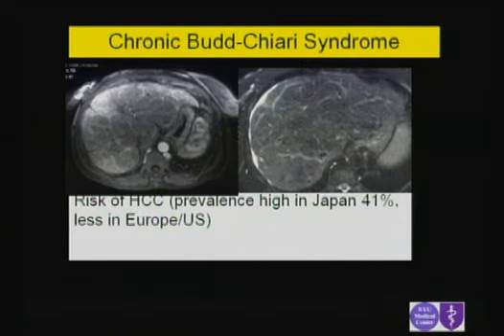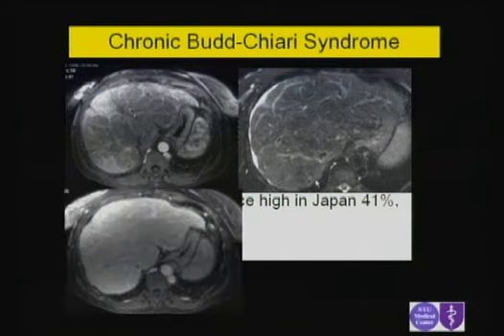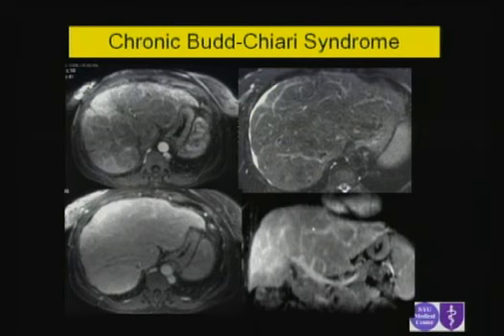nodular liver, a little bit globular in appearance, with small ascites. You see only one vein here on the right, which is a little bit tortuous, abnormal in appearance. The delayed venous phase shows you only probably one abnormal vein. There is no other vein. There is no middle vein and left hepatic vein. And on the coronal format from the T1 weighted sequence at the venous phase shows you multiple collaterals in the liver. This is typical for Budd-Chiari.